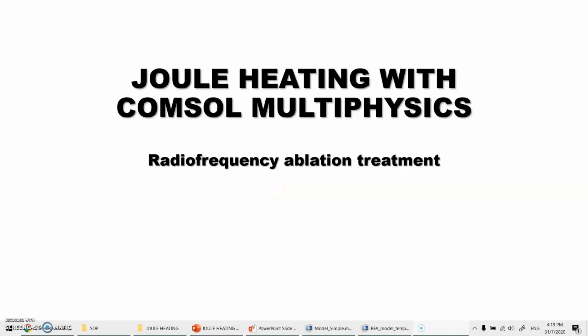In this video, I will show you how you can use COMSOL Multiphysics to simulate Joule heating. I will be using radiofrequency ablation treatment, which utilizes the principle of Joule heating, as an example to illustrate the steps.